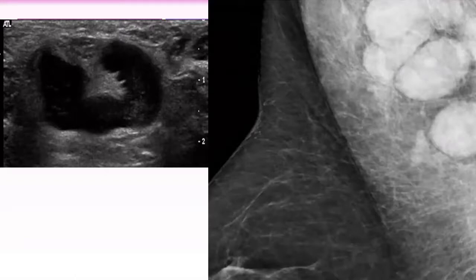The part of the mammogram shows multiple large, dense axillary lymph nodes. By ultrasound, the lymph node is... What else about these lymph nodes? They are dense, oval, and some are rounded. What about the hilum? The fatty hilum density is not shown. Okay, losing the fatty hilum.